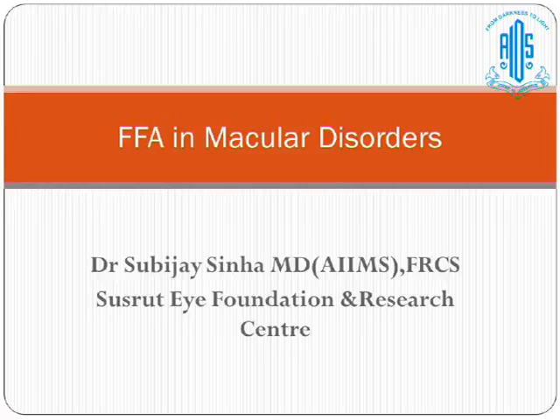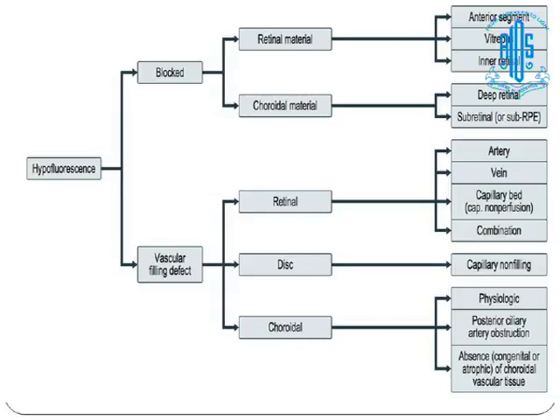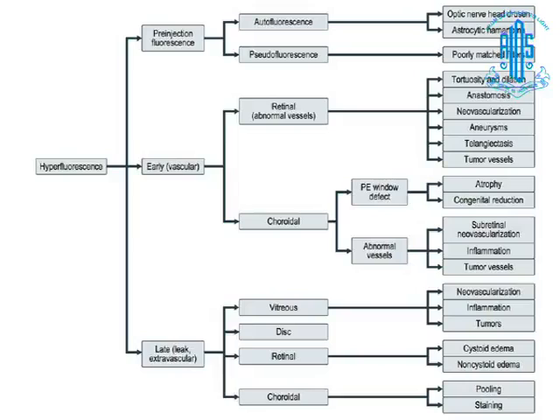I will be presenting the role of fundus fluorescein angiography in diagnosing and treating the various macular disorders. Now, in fundus fluorescein angiography, the abnormal fluorescence consists of either hypofluorescence, which may be due to blocked fluorescence or due to vascular filling defect, or hyperfluorescence, which may be due to leak or staining.